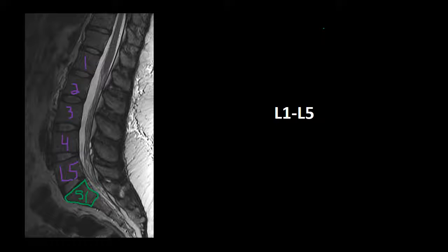I also quickly want to point out the shape of an intervertebral disc on this image, and they lay right in between the vertebral bodies in this oval shape. And I'll outline that in this blue right here.